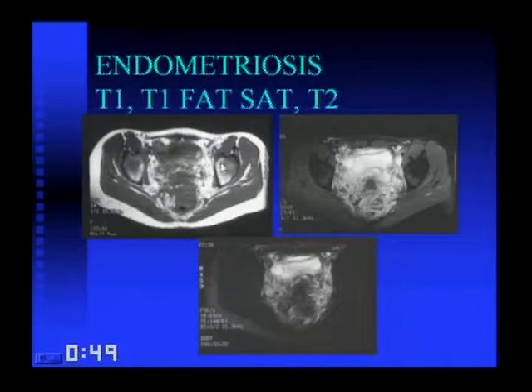Notice it's bright on T1, it stays bright on the T1 fat sat, so it's not fat, and it's bright on T2, and this was a small endometrial implant.